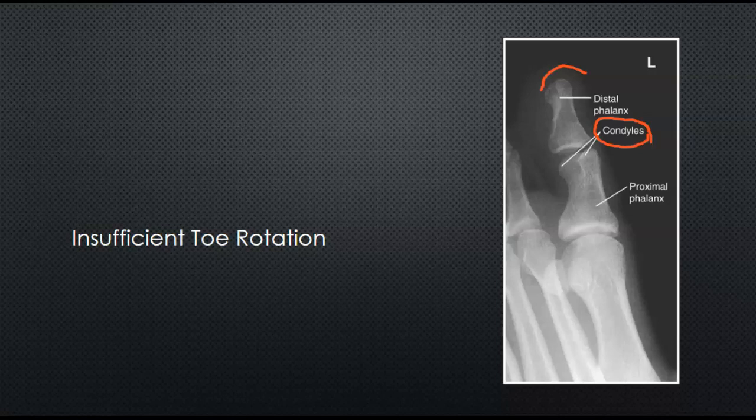And so another key indicator to understand if we're insufficiently rotated is when the metatarsal heads here are demonstrated posterior to this first toe, okay, and which they are. This is a left foot, you're turning it in medially, so therefore these toes or metatarsal heads are posterior, okay. That is how you should be able to identify that we are insufficiently rotated.